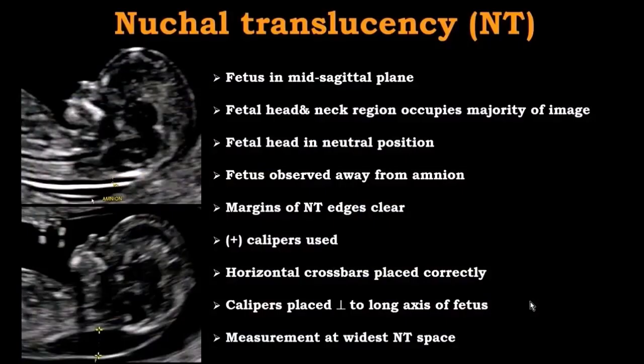It's very deeply related to the introduction to clinical practice of the nuchal translucency measurement that happened more than 20 years ago. Here you can see two fetuses, with the nuchal translucency measurement in normal and abnormal conditions, and the strict criteria that need to be followed to obtain the perfect view to measure it.